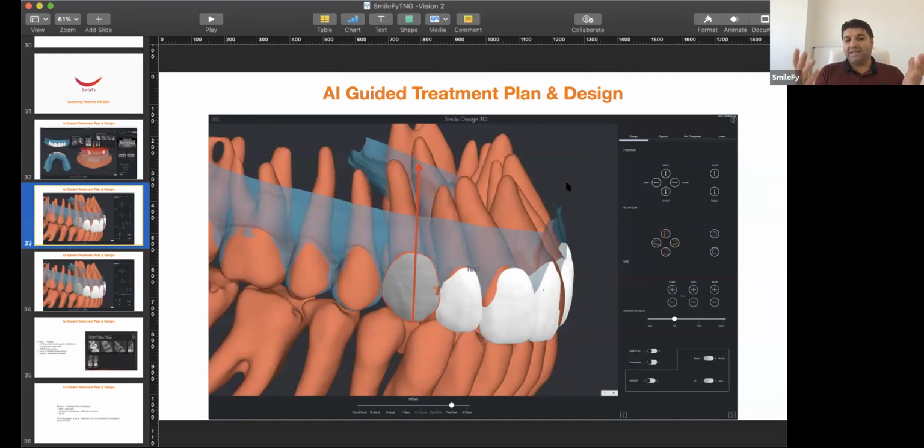We cannot go with the ideal design when behind the ideal design is a lot of treatment: ortho, perio, implants, and so on. This tool helps us now. SmileFy helps us to create an interdisciplinary planning, to visualize every single issue linked to the design and to have an overview of the treatment.